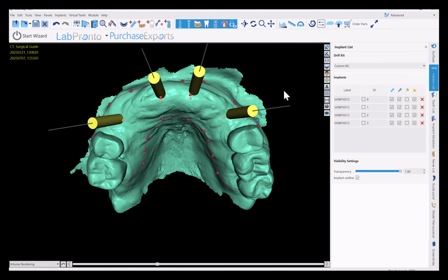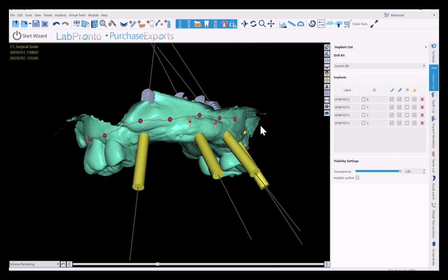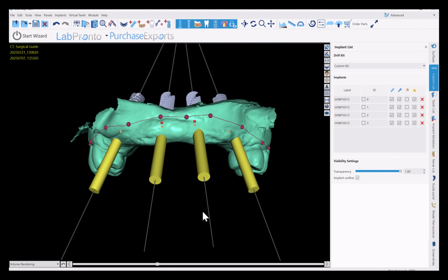So it would be a lingualized incision, and that's ideal because that's going to give you that gap where you're not getting primary closure after you've got healing abutments on, and it's going to force that gingiva to granulate in and create more keratinized tissue and give you a broader band. We can certainly use the tissue being thickened up on this buccal too, if in fact we're going to have to jump out that far with our implants.